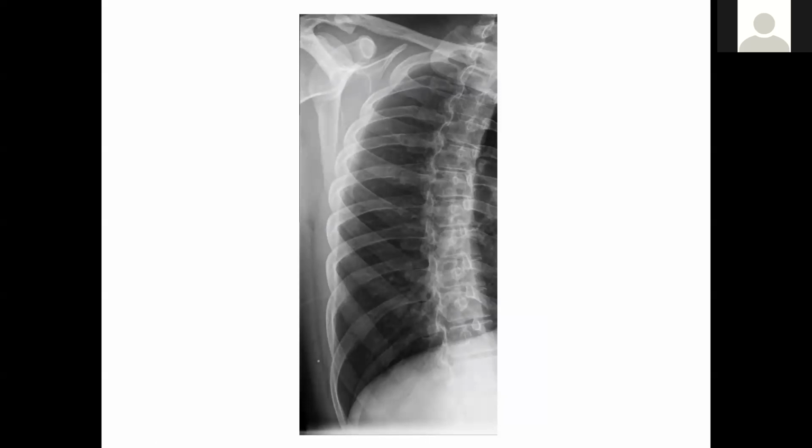This is the same image from before, the bilateral rib projection, just cropped so that you would see much better collimation for a unilateral foreshortened ribs. If you're positioning for these, you don't need light covering all of your patient's neck. You need light going from the skin line to the jugular notch, or the spinous process of the easily palpated C7. That will get everything that you need on there.